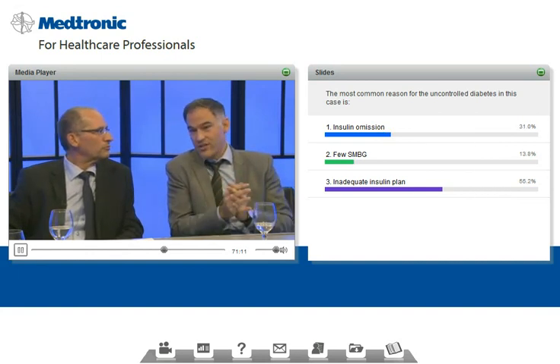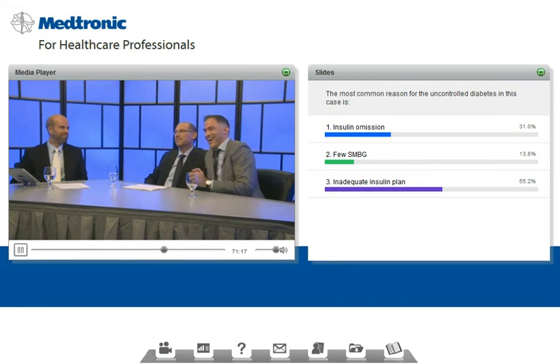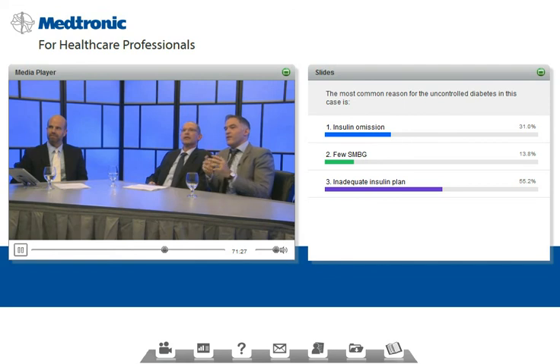He's kind of engaged. He's checking sugars, and, am I allowed to comment on that? All the time. Sure. Okay. Actually, can we see the output? You want to see the download, right? The download, yes. Can we switch back to the program? I'm sorry. Actually, can everyone see this at home, or are we supposed to describe the results? No, they should be able to see it at the moment.